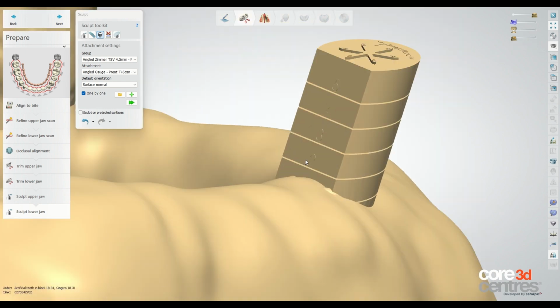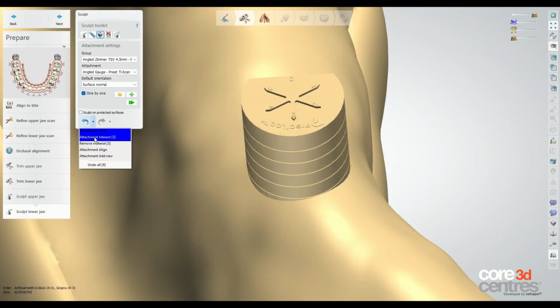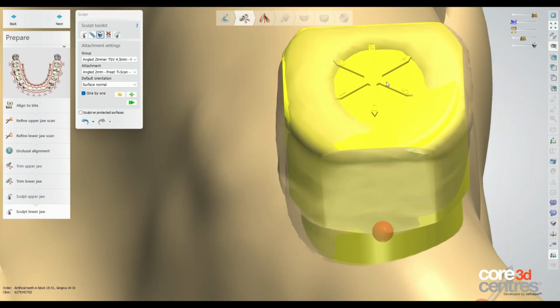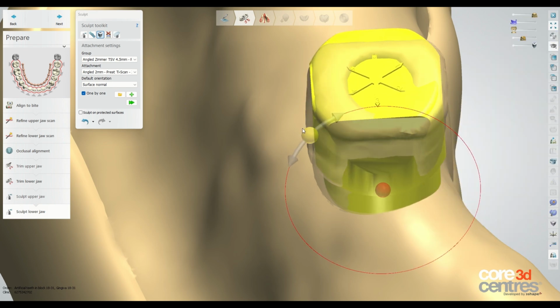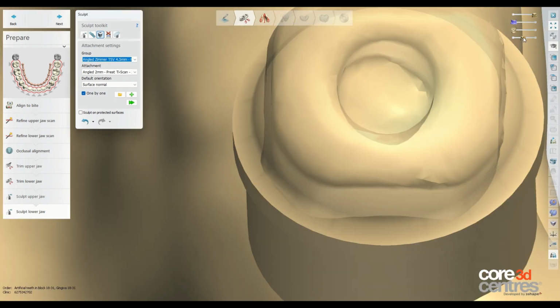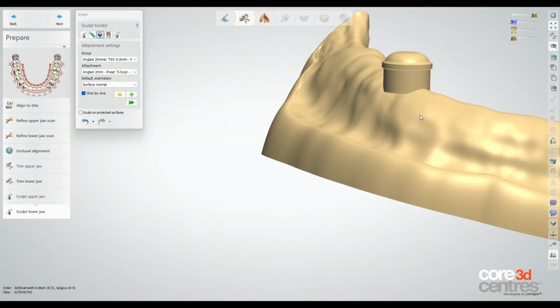The new position should allow you to accurately determine the cuff height. Once the cuff height is determined, revert the steps as we did in the straight abutment, selecting the right cuff height angle attachment and proceed until you finish the step where you remove the scan body. During this step, rotate the yellow template to the same orientation number as what we notated before and apply the changes with the green arrows. This should place the abutment and housing template in the most optimal orientation to facilitate insertion.